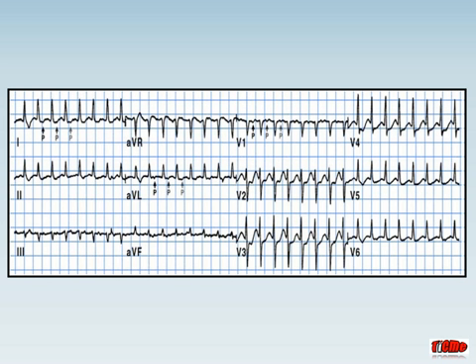Okay, so we've done AVNRT, and remember I said that 10% of paroxysmal SVTs are something else. So we look at this example. We're seeing these little pseudo waves again. Now, these are P waves, and if we have a look at the distance, they are still inside the 50% RR interval. So if we're measuring the R to P distance, it's still short. There are other little deflections in the baseline here, which with the eye of faith we'll call P waves as well. Probably best seen in AVL, this little deflection down here.